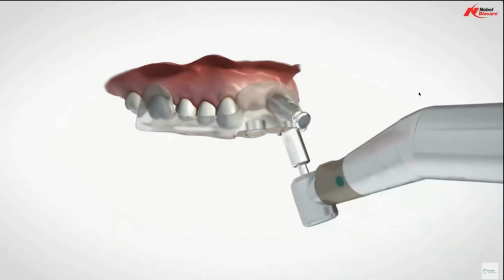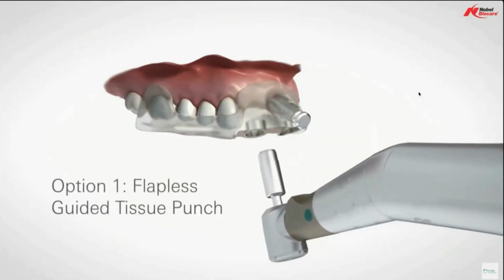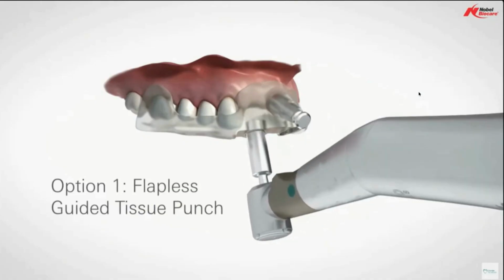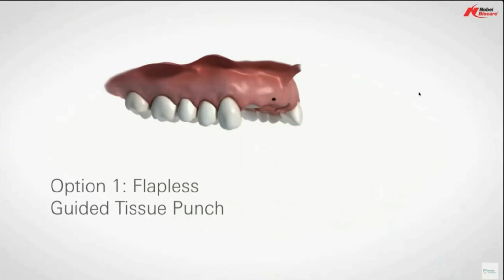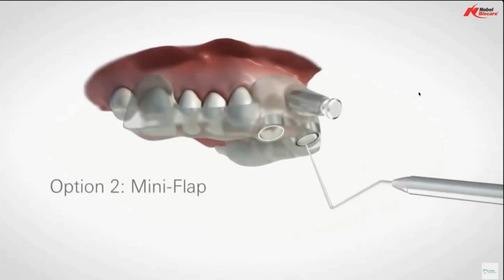We tend to use these when we're placing 3 or more implants, or replacing, say, 4 or 5 teeth, where we don't want the surgical template to capsize when you're doing the surgical steps. In this case, this happens to be Nobel, but a lot of the companies are very similar, where you use a tissue punch, either a manual one or machine.